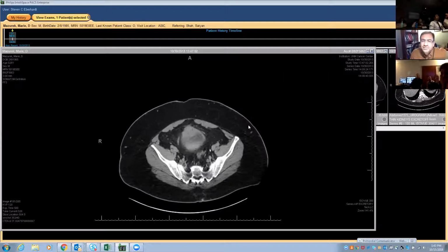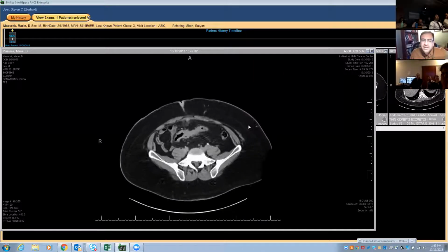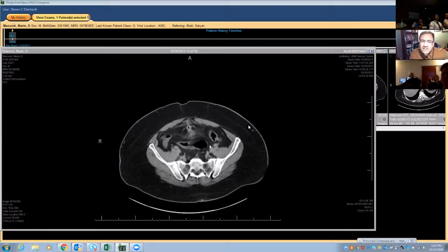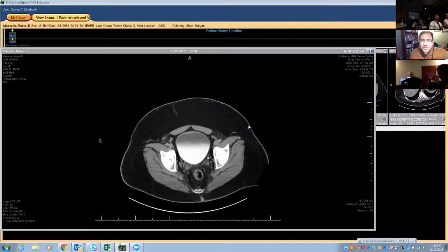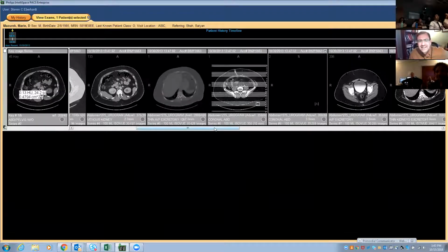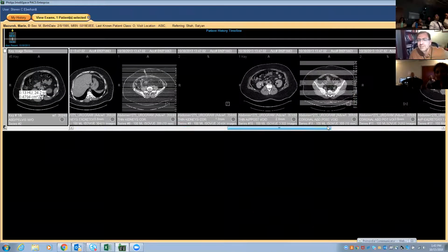There was no cancer in there. It was just inflammatory. By the time it went to pathology, it was like old inflammatory change because it was mostly solved with antibiotics. And that's the only case I have, but it's kind of interesting. Never saw one before. Maybe I can find the sagittal image here, which I didn't look at before.